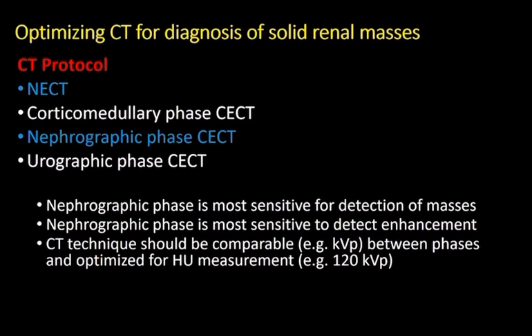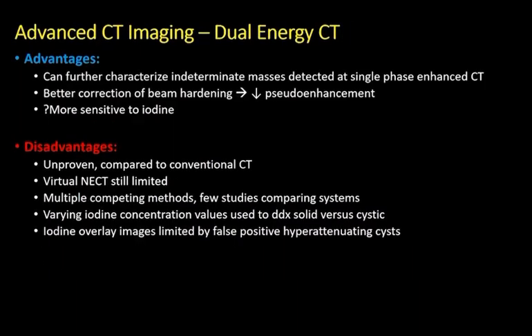relationship to the collecting system. Dual energy CT has been applied and validated for renal mass evaluation. Advantages of dual energy CT are that it could further characterize indeterminate masses detected at single-phase enhanced CT.